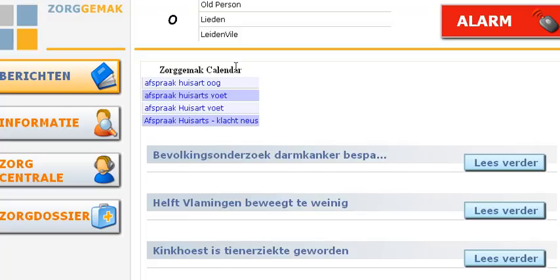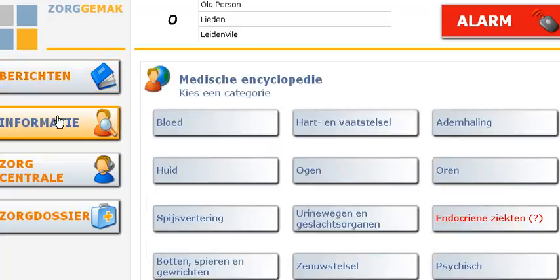So what we now have is a user interface where we have messages here. It's a small calendar. It's of course for demo purposes. Here RSS feeds. We have common information here on blood pressure and so on. This is ICD-10 code. We have an RSS feed from Access to actually fill this medical data.